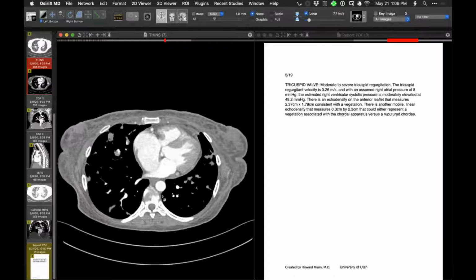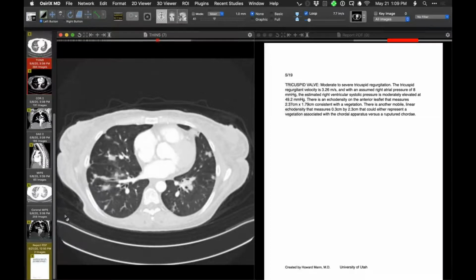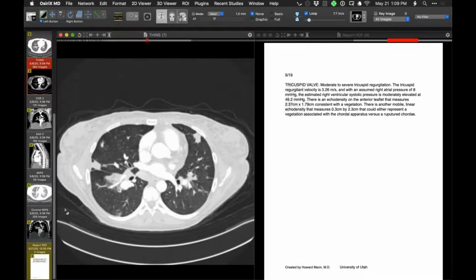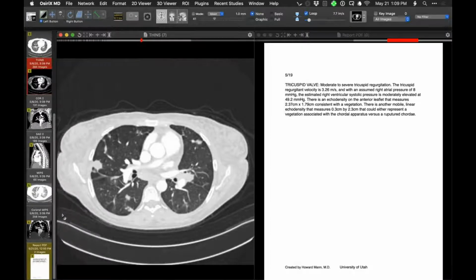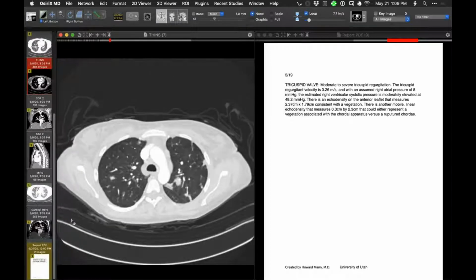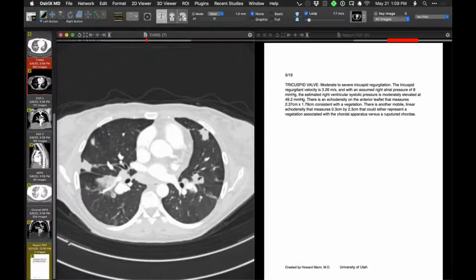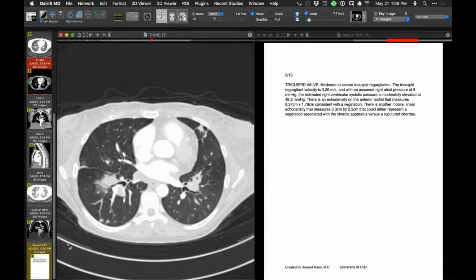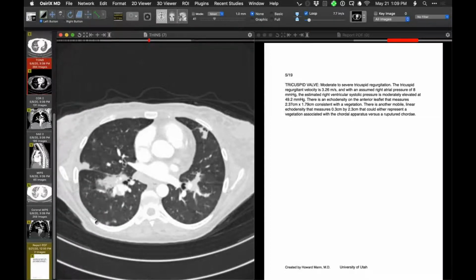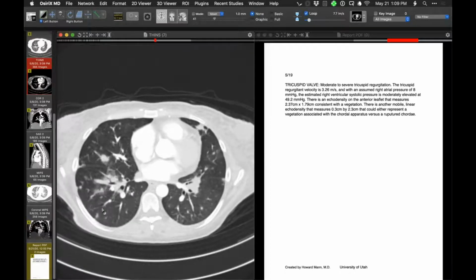Can you show the lung windows there again? Because one of the things sometimes I found helpful is distinguishing a bland infarct from a septic infarct. Many septic infarcts often have a halo around them because of the inflammation and maybe some hemorrhage, whereas your bland infarcts tend to be tightly marginated, at least when we see them. But in that anterior middle lower lobe right there, it's sort of fuzzy looking. Yeah, there could be vascular occlusion and a true infarct there for sure in that particular location.